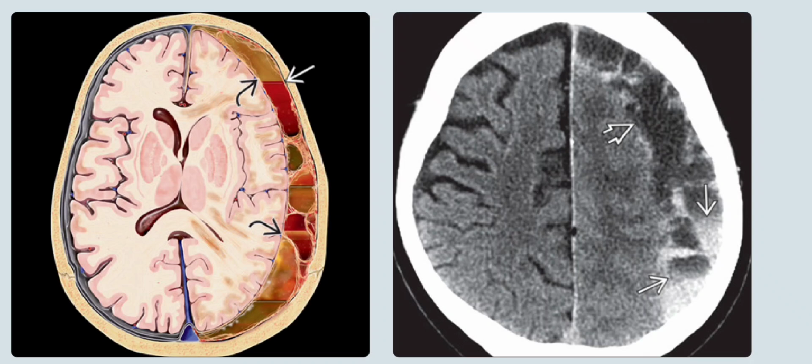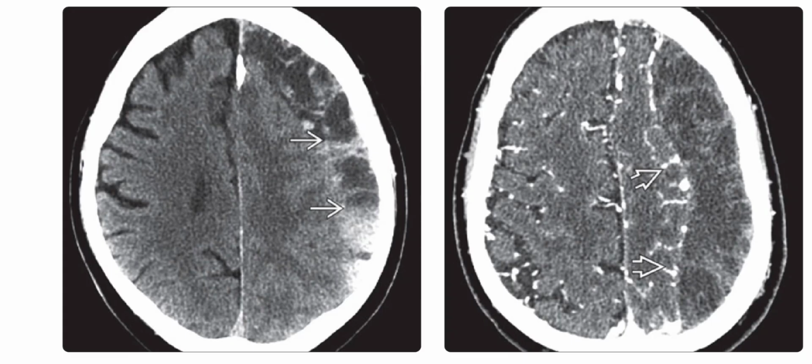Right is the axial non-enhanced CT scan, and it shows the classic left-sided mixed subdural hematoma. Also note the multiple loculations and the fluid levels which are formed by the acute re-hemorrhage into the pre-existing loculated chronic subdural hematoma. So again, some more images of chronic subdural hematoma.